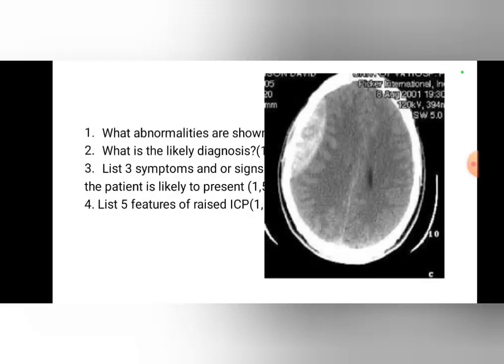Now the next question, what is the likely diagnosis? Since it is biconvex or convex shape, your diagnosis here is epidural hematoma.